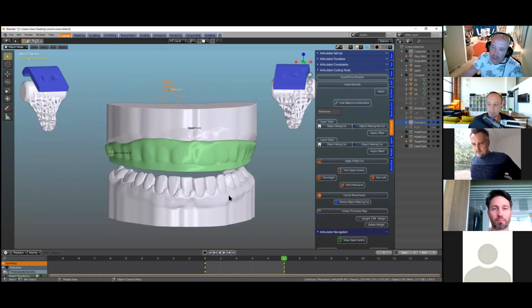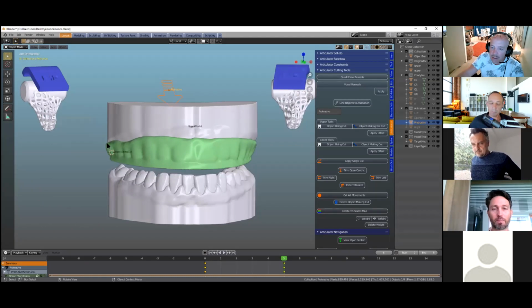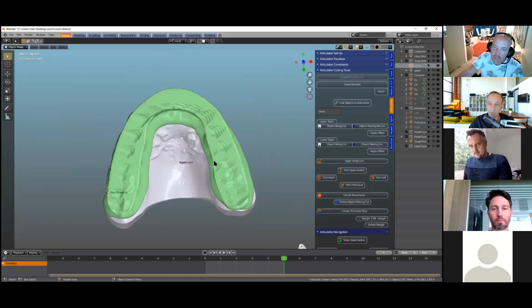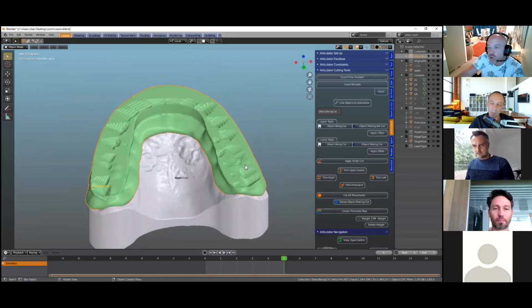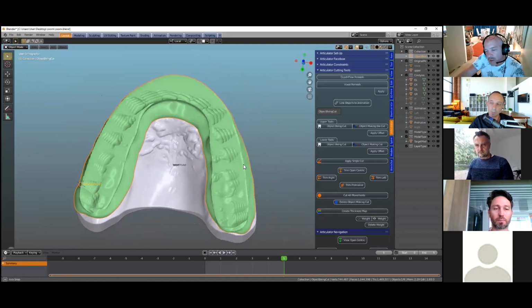Yeah, absolutely. So the last thing that we do is cutting the actual fitting surface, and that has to be the last thing. If we want to, we can smooth this down, because if we print it like that, we're going to end up with these ridges.